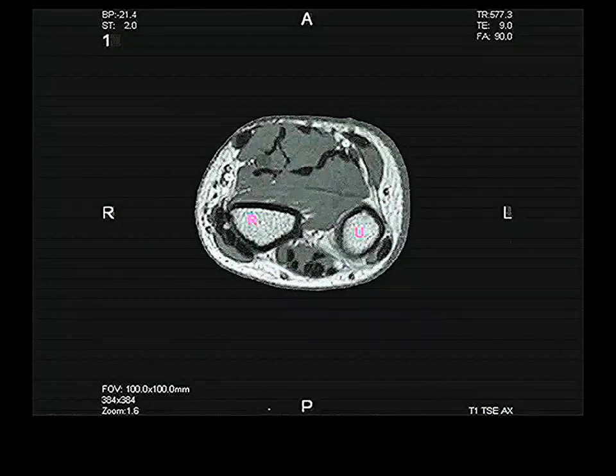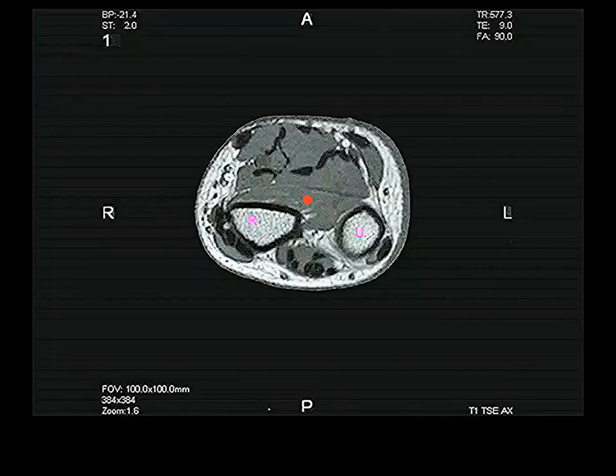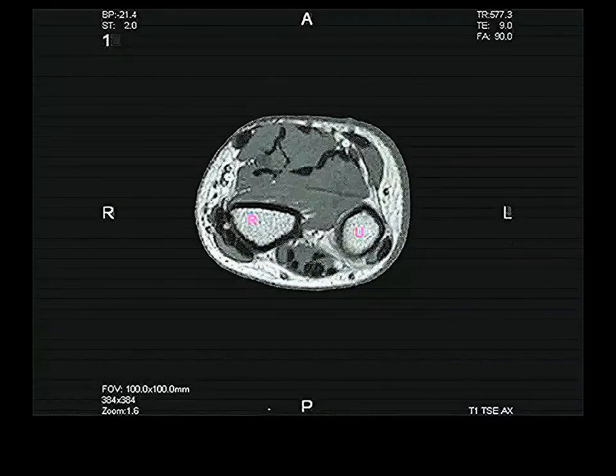And then we'll go through these quickly. This is radius and ulna, just above the wrist joint. I really should have labeled this first because this gives you a very good idea of the level you're at, because there's only one place where you would find a muscle which runs transversely from ulna to radius, from side to side. That muscle is called pronator quadratus. So this tells you where we are, because that's in the distal portion of the forearm.